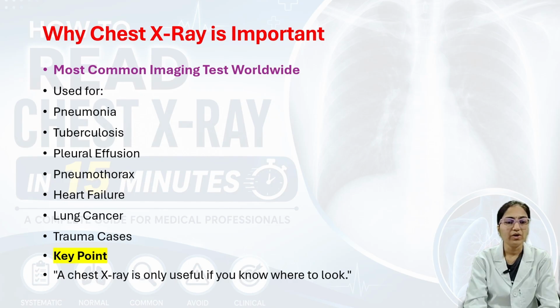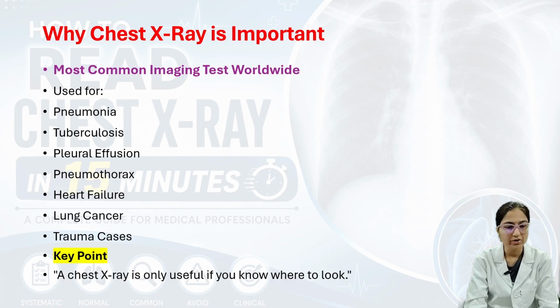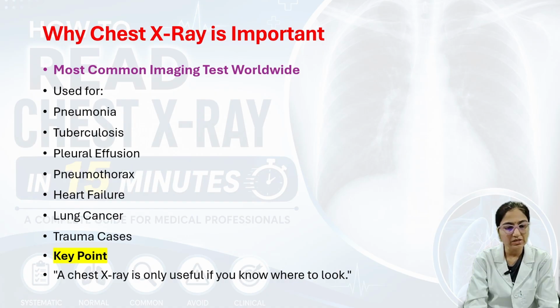Why is chest X-ray important? It is the most common imaging test worldwide. It is used for pneumonia, tuberculosis, pleural effusion, pneumothorax, heart failure, lung cancer, and trauma cases. The key point is that a chest X-ray is only useful if you know where to look.